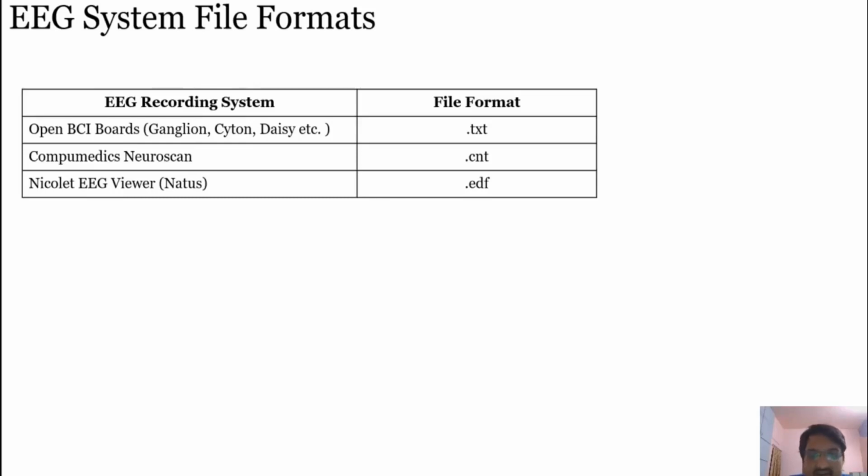So all of you have seen a demonstration of EEGLAB. Now most of you have some idea about which kind of software EEGLAB is and how you can convert your GUI operation into scripting using the EEG.history variable, because EEG is a data structure. We will see in the upcoming data acquisition demonstration videos that it's basically a structure in which history is one of the fields, which stores the equivalent command for whatever operation you do.